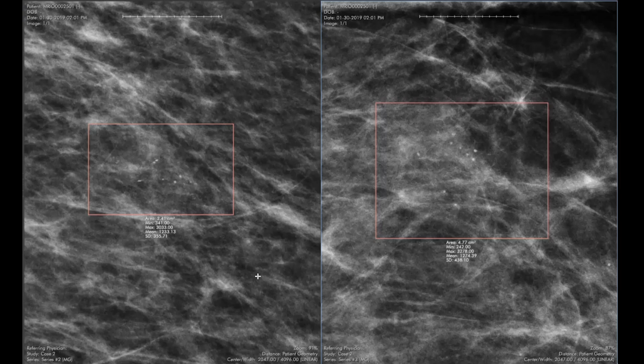And they are spanning about a centimeter, a little over a centimeter, so the distribution would be grouped. These are grouped round or punctate calcifications that we saw on a baseline screening mammogram. This is the second good indication for a BI-RADS 3. So this was given a BI-RADS 3. We had the patient follow up recommended for 6 months, 12 months, and 2 years.